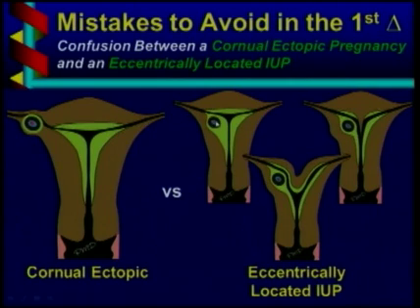You can get a pregnancy, sometimes the uterus is normal, but the pregnancy, instead of bulging inward, bulges a little outward. So you get an eccentric pregnancy, but it's within the uterus. It's just a normal pregnancy, and as this grows, it will grow into the center.